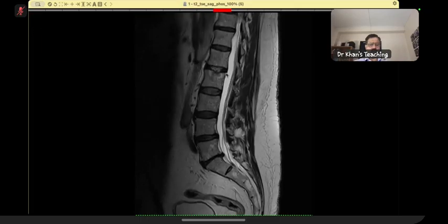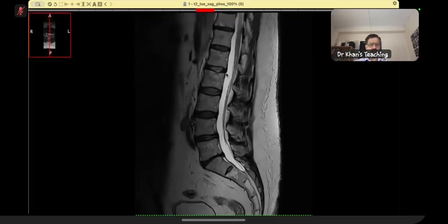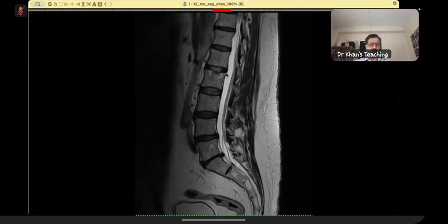And we know that intravertebral disc herniation is a very common finding. It's an incidental finding, usually of no significance. What happens is that at the end plate, there is a weak point where the disc herniates inside. Usually, it's a very, very benign condition. A patient can have many intravertebral disc herniations and things like that.